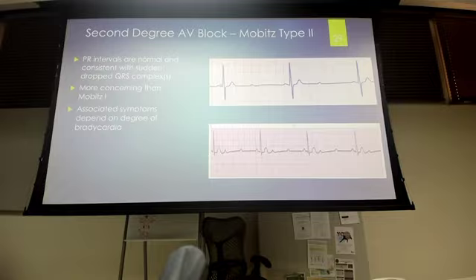But I have this. What happens is your P waves will march out, but you're missing a T wave with that P wave. You're missing your QRS complex with that P wave. So march out your P waves. My P waves seem to be depolarizing just fine. Why are my QRS complexes not showing up? They're not because we have a complete block of conduction down.